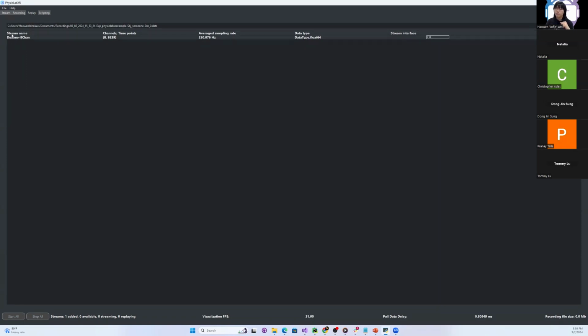So in the stream names, you will see all the streams contained in this recorded file, and how many channels and time points for each stream, and the average sampling rate, as well as the data type for the stream, and how you want to simulate the stream.